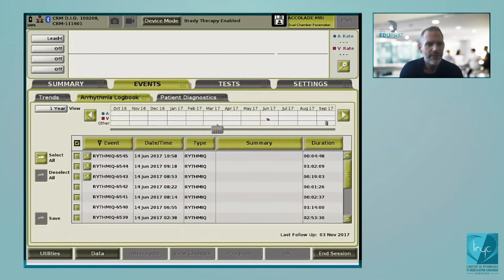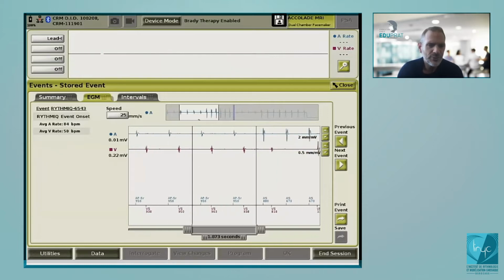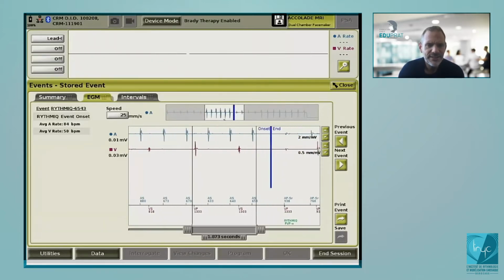the third one now, the third rhythmic, it's about the same, but you see here 1 block P wave, so a long cycle, and this cycle is spontaneous. It's a VS, but it's also considered as a long cycle. Remember that a long cycle is either a backup VVI pacing, so 15 beats slower than the minimal heart rate, or a spontaneous ventricular cycle if the cycle is 150 milliseconds longer than the minimal pacing interval.